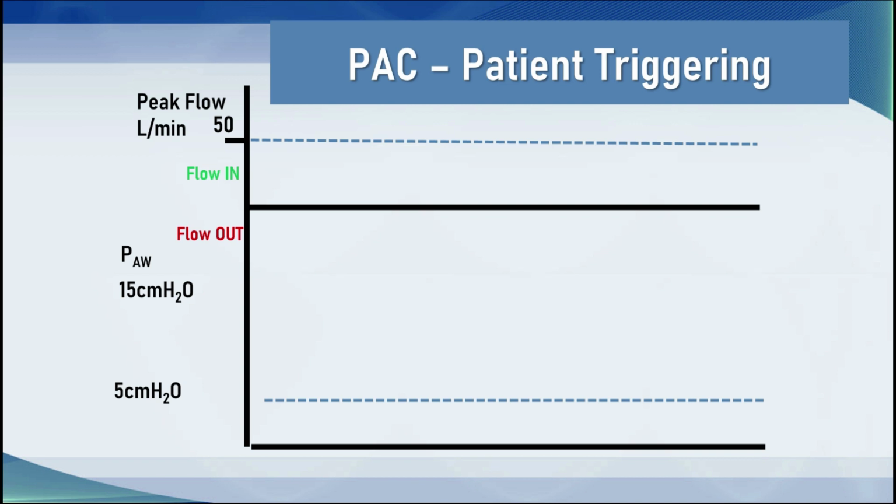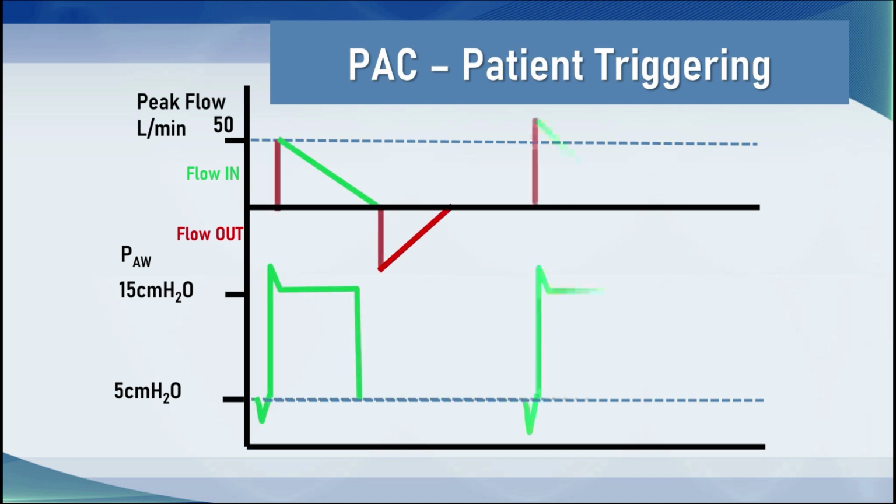When a patient triggers the ventilator, the driving pressure must change because the magnitude of negative pleural pressure impacts the alveolar pressure. The greater the inspiratory effort, the greater the pressure ramp between the alveoli and the pressure limit that has been specified by the ventilator operator. Of these two breaths, you can see that breath number 2, the one on the right, is associated with a greater inspiratory effort that is evidenced by that bigger negative deflection down from PEEP, and as a consequence you can see that the peak flow here is higher for the second breath than the first.